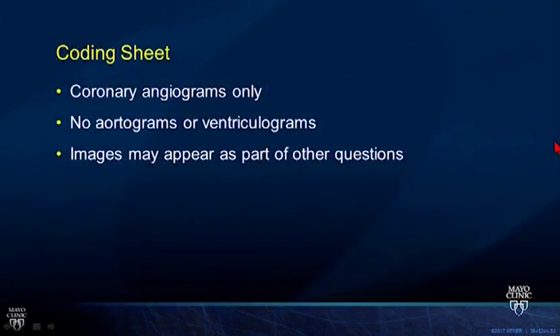So for our coding sheet, it will only include coronary angiograms. There won't be any aortograms or ventriculograms. Images, though, may appear as part of other questions. So I will go through some aortograms and left ventriculograms for you for the rest of the boards and also for your clinical practice, as these are still indicated in many situations.